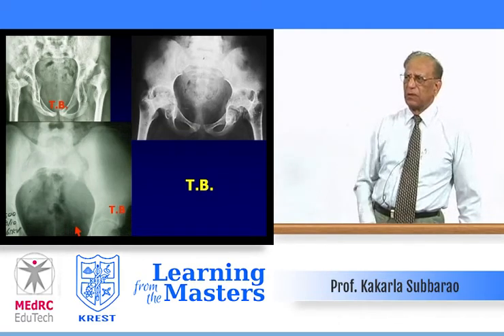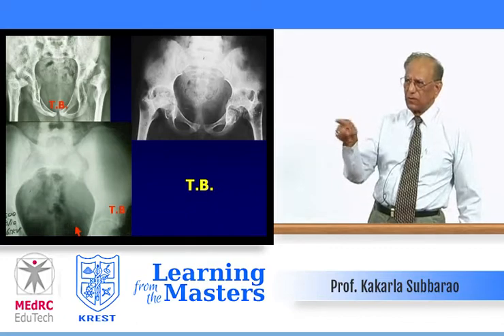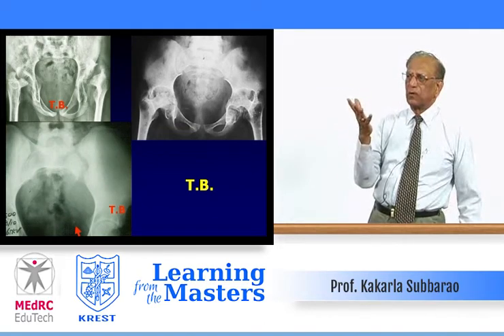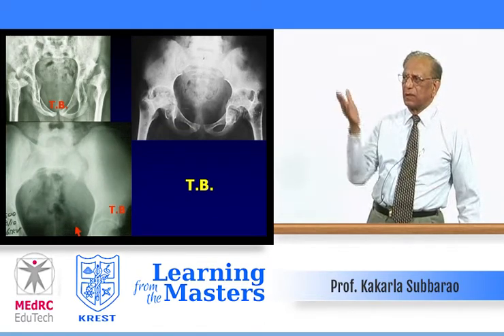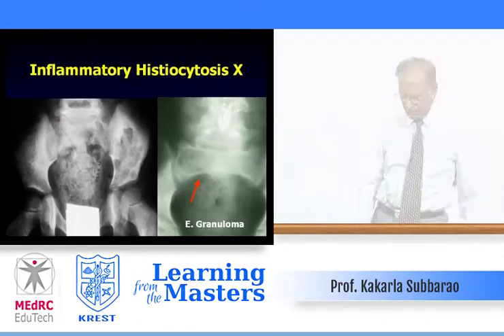Again, here note the sacroiliac joint erosion, widening, and then soft tissue swelling, which the arrow depicts inferiorly. And when the hip joints are involved, purely lytic and destructive, and occasionally bony ankylosis may occur, as you see in the right side of the pelvis.